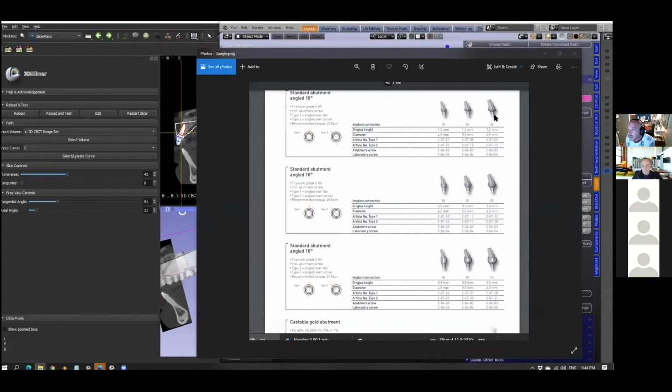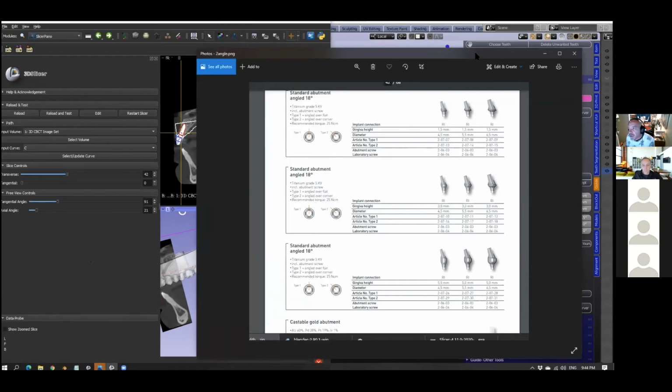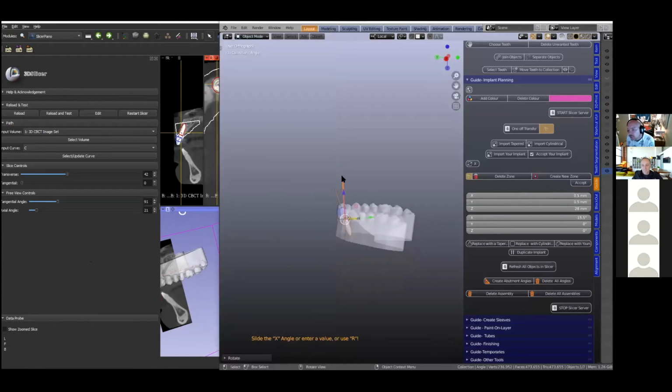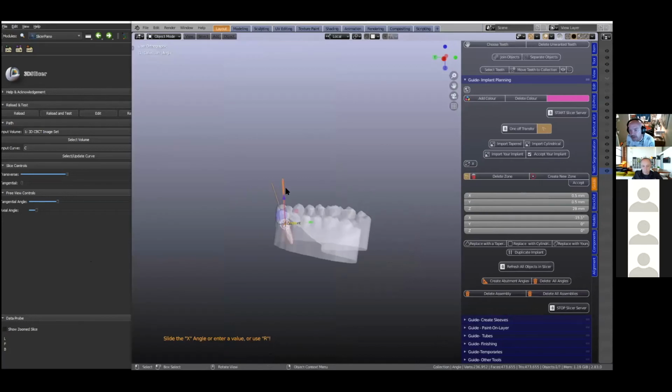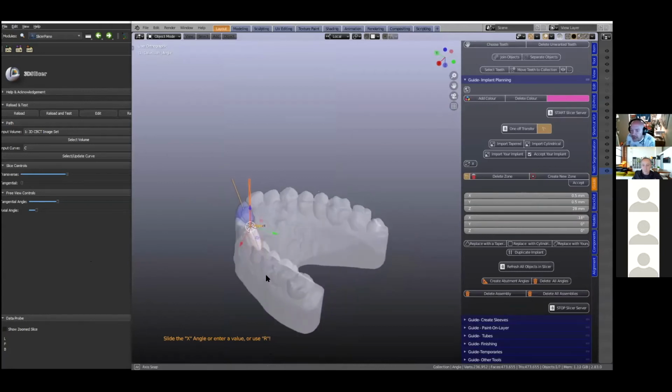It's nice and tall, so let's choose this one. I know this is 18 degrees, so I'm going to make this angle 18 degrees. I've got that pink little thing selected, and I'm going to type here -18. Now this is the angle it comes out.